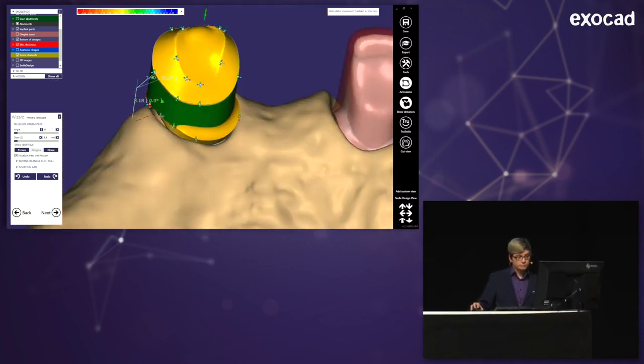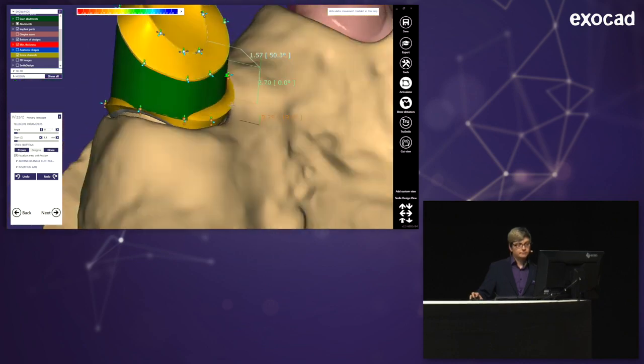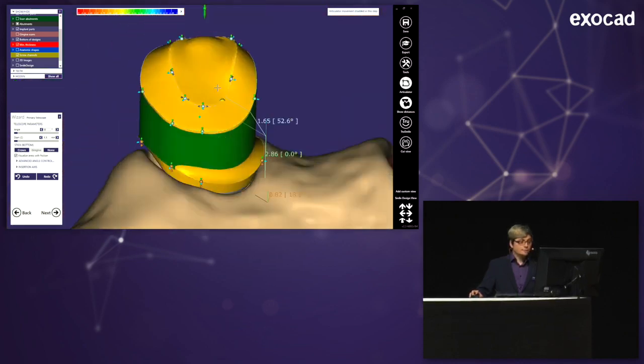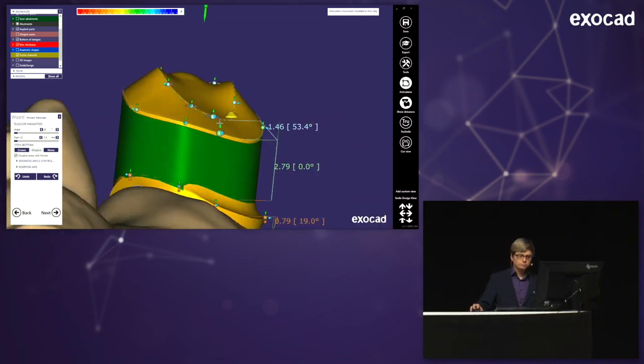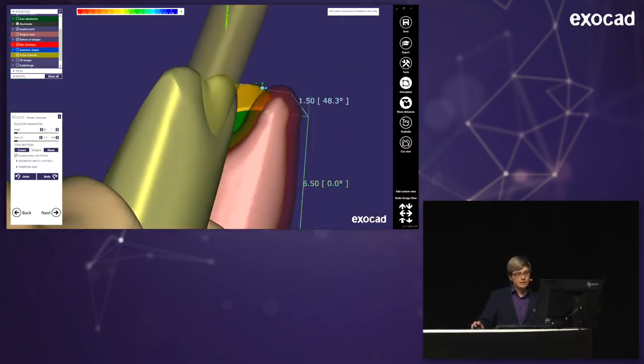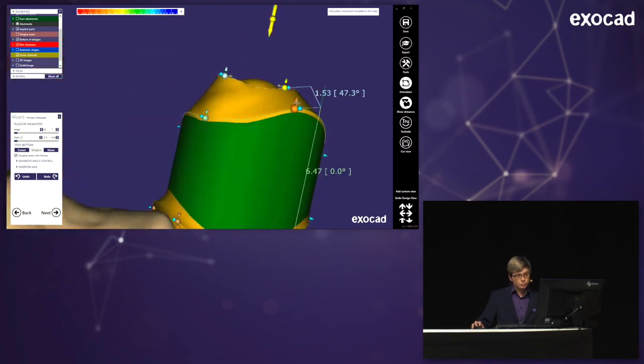And the lower shoulder will not be here in the end, at this point. So now I'm trying to get all of those points here on approximately the same height. And you may see why later.